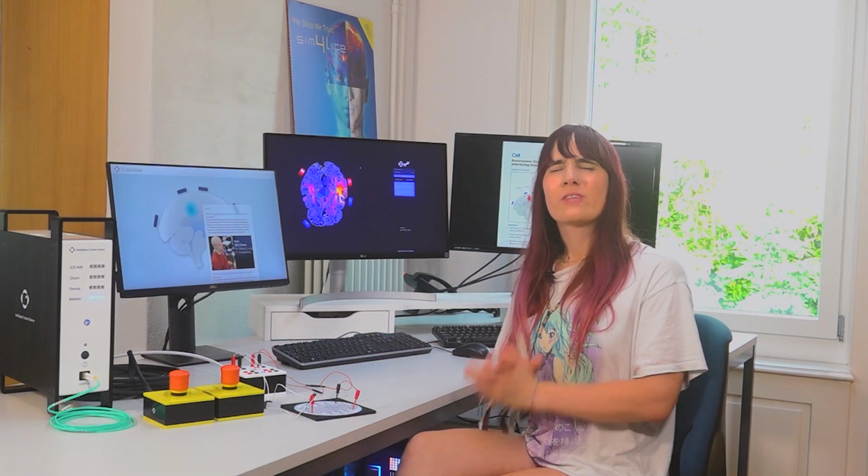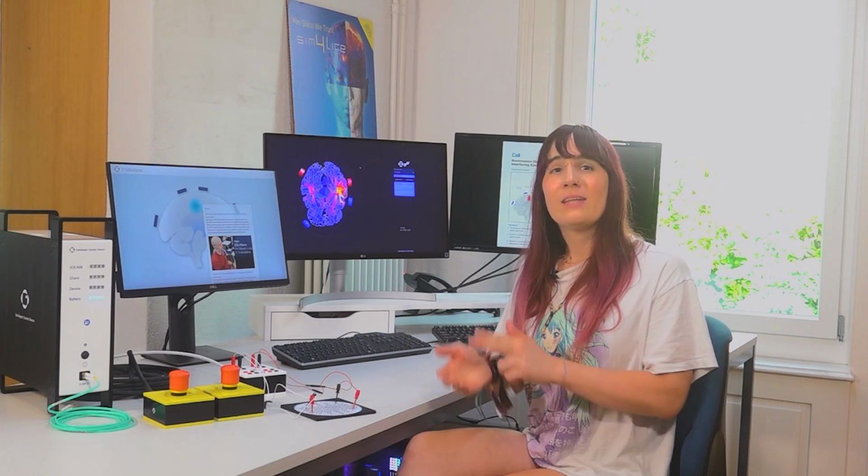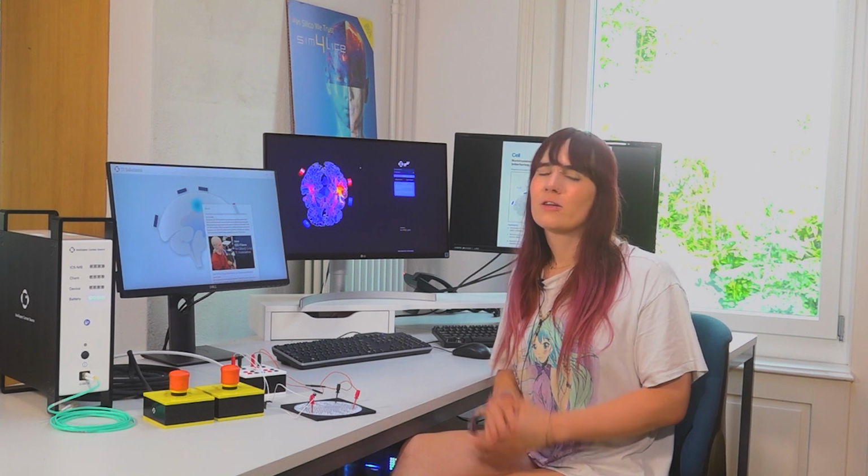TI requires careful optimization of stimulation parameters, electrode locations, and current to ensure selective activation of the brain region of interest and to avoid off-target stimulation. A challenging task considering the large parameter spaces and the complex dielectric environment of the human head.